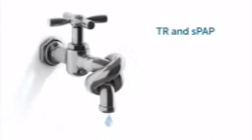But for you to remember, look at the shape of the left ventricle. If it's not round, but more in a D shape, suspect a disease of the right ventricle, most likely pressure, but it sometimes can also be volume overload. When we assess the right heart chambers, we also have to look at tricuspid regurgitation and systolic pulmonary artery pressure.